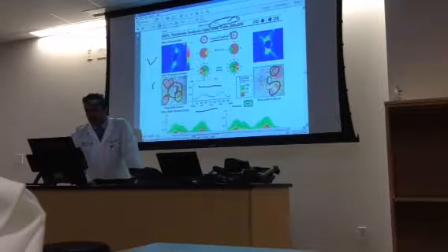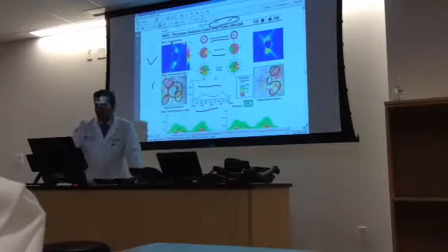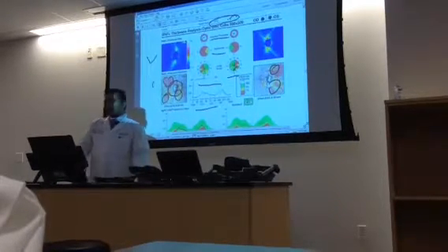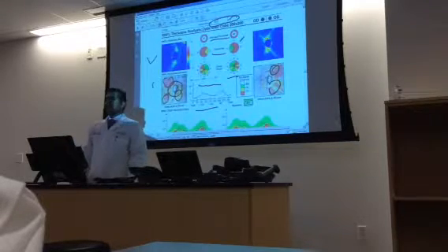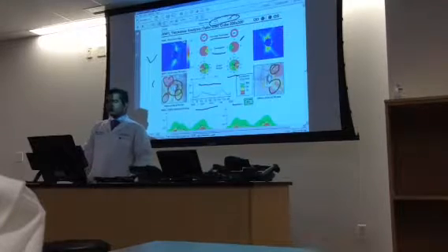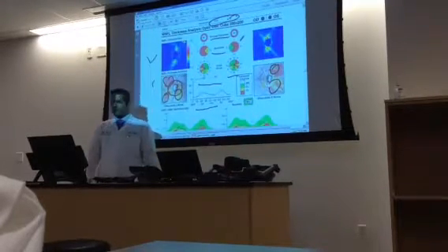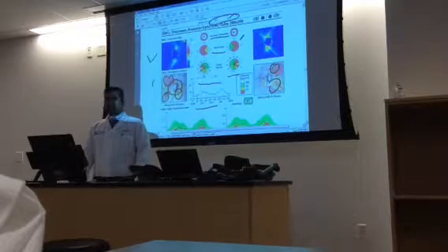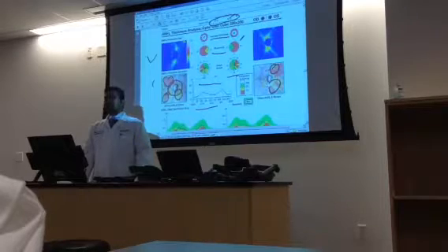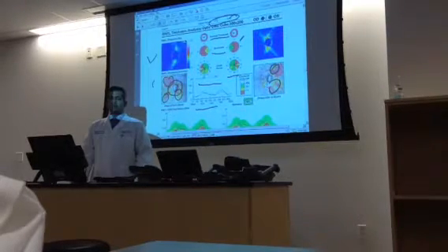You have average thickness, you have quadrants in various quadrants, you have clock hour thicknesses. Clock hour thicknesses tend to vary a lot. Average values tend to be very stable in measurement. So I wouldn't jump on just one isolated clock hour being abnormal. However, if you do see one isolated clock hour abnormal, you can go back to the nerve head and see if you are seeing a notch there. You may have missed it the first time, but you might go back and be able to find a notch.